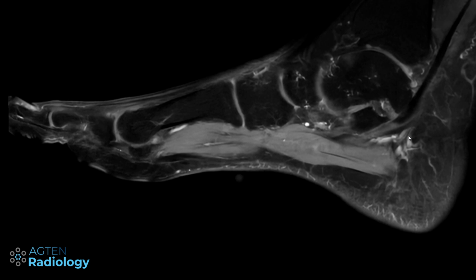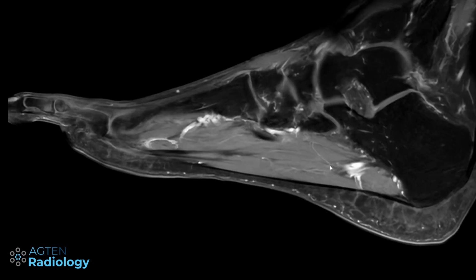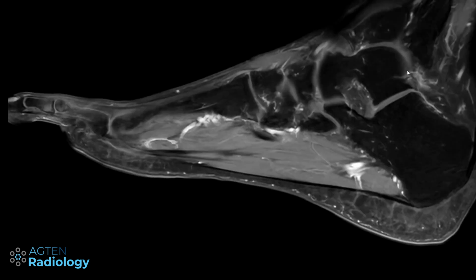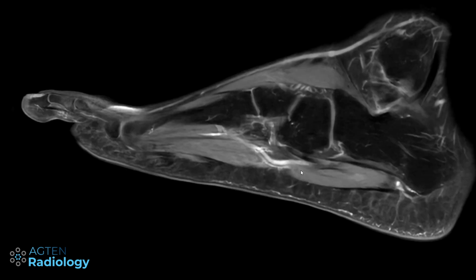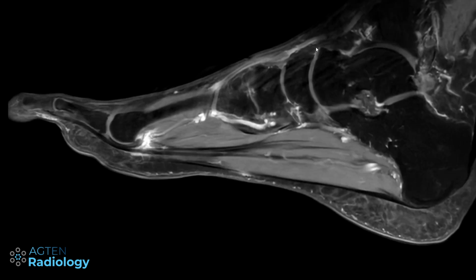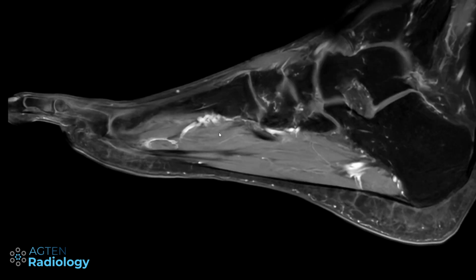Artery, vein, then we have here the two, so the medial branch, then we go to the lateral side. This is the lateral malleolus. So we have the lateral plantar vein. They form the plantar arch. Now you can see the connection with the dorsal foot veins, which we did not cover in this video.